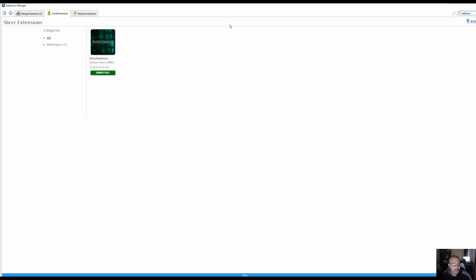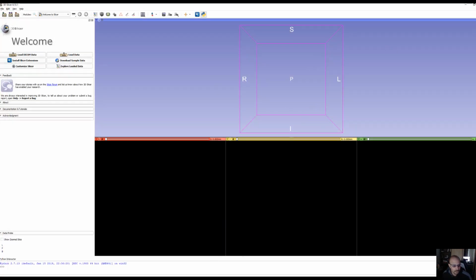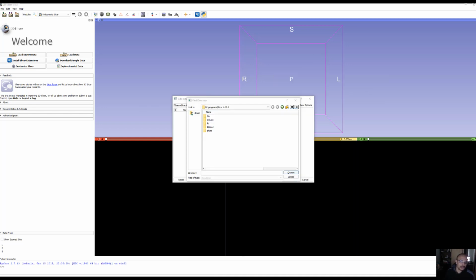So once you've done all of that, then you can start watching this video again from here. Okay. So now I'm just going to load up the cases you've sent me. Here we go.